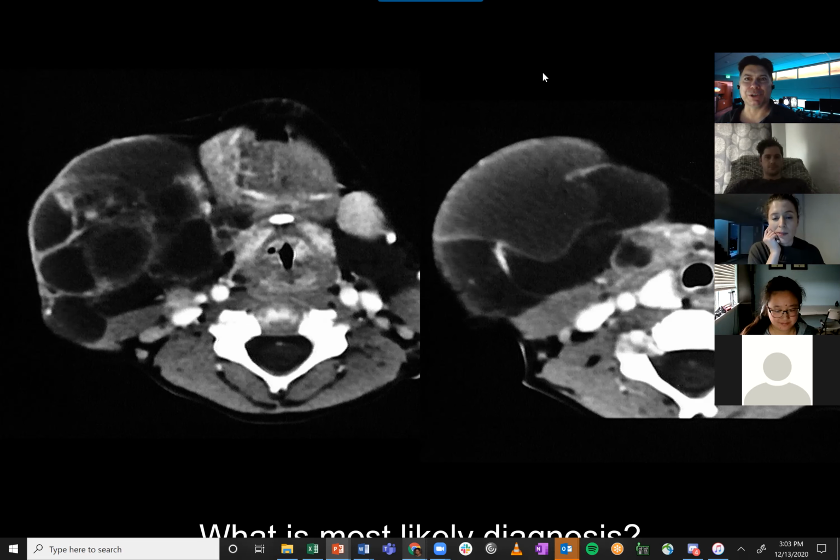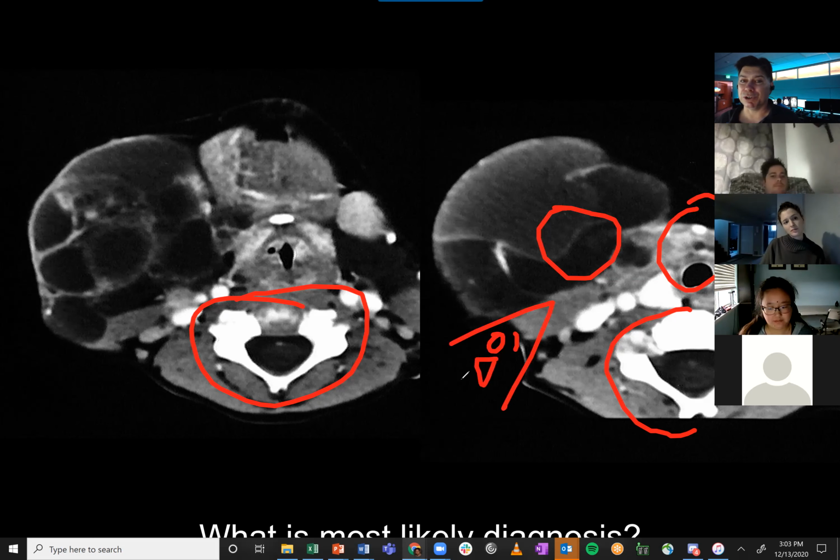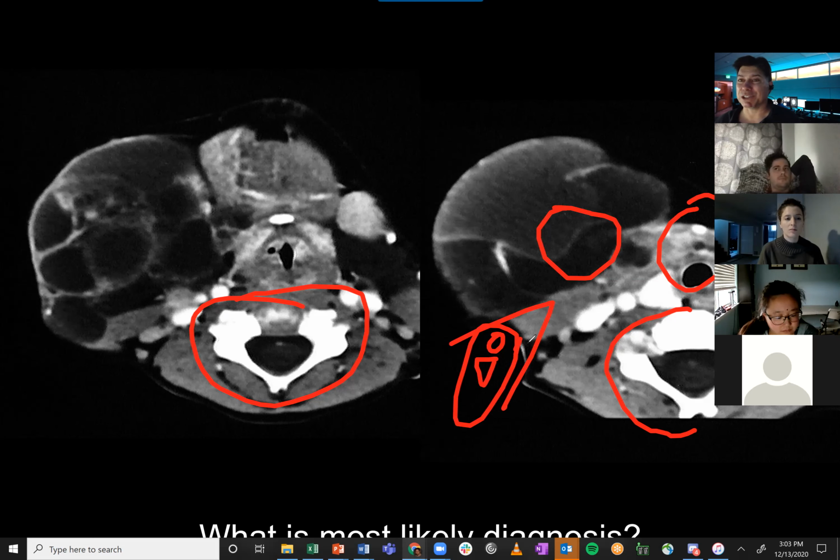Well, what do you think about the size of the vertebral bodies compared to everything else? I guess they're relatively big. It looks like they're huge. It looks like the vertebral body is half the neck, front to back. And if you go up higher, this kid's eyeballs are this big. Strangely, the eyeballs and even the inner ear, if you look at the temporal bone, the ice cream cone and the ossicles, they look huge in a kid because when you're born, the temporal bone and the ossicles are normal adult sized and the rest of the body grows up around them. Okay, that's useful.